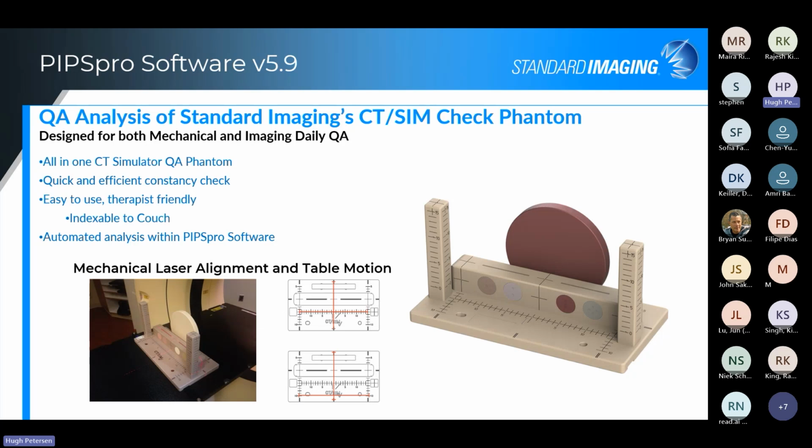Basically, PIPSpro software has been around for a while, and we've consistently updated it, adding features and adding functionality to it. And this version is no different. We're adding the QA analysis of our CT SimCheck Phantom. And you'll see the CT SimCheck Phantom there.